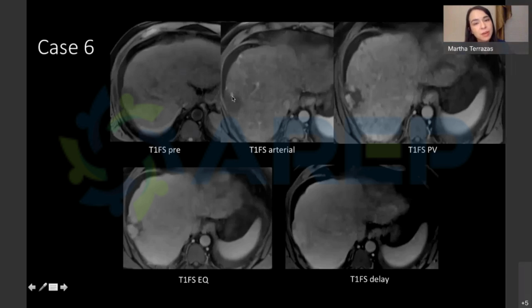And then we look at this and we're like, oh, here we have some nodular peripheral enhancement, discontinuous, right? It fills in on delayed phase imaging. Okay, hemangioma, are we done? No, right? We've got to look at that T2. We either need a T2 HASTE or we need a T2 fat sat, and it needs to be bright.